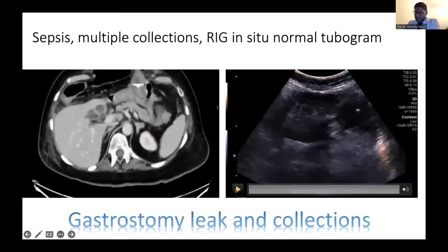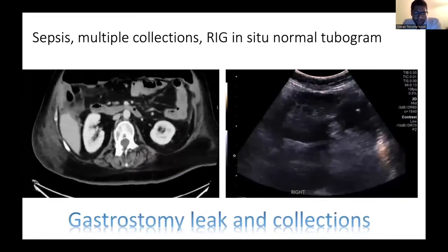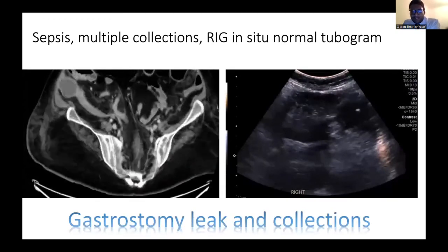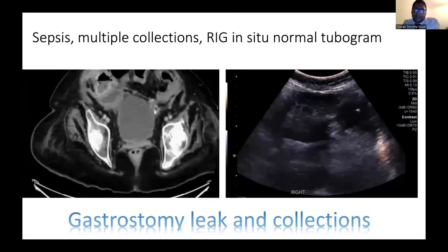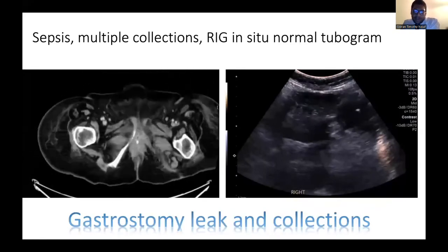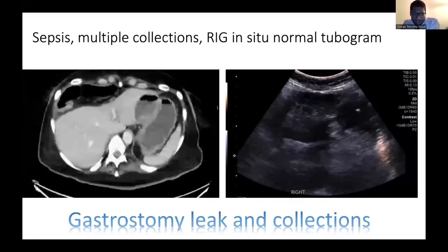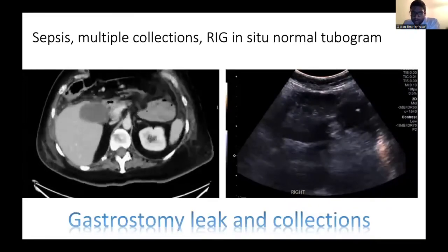Moving slightly out of the liver, I want to show you a few other cases because I think that this can also help your case for building contrast enhanced ultrasound in your practice. Simply because you have a liver patient doesn't mean their only pathology is from the liver. There can be many different causes, and usually they are comorbid from a number of other reasons.